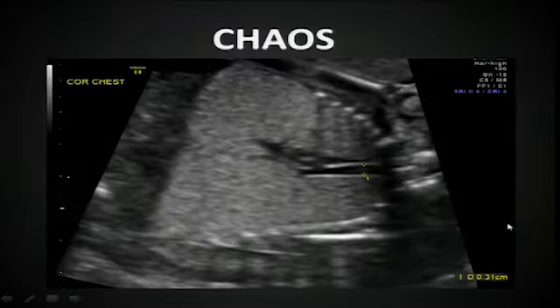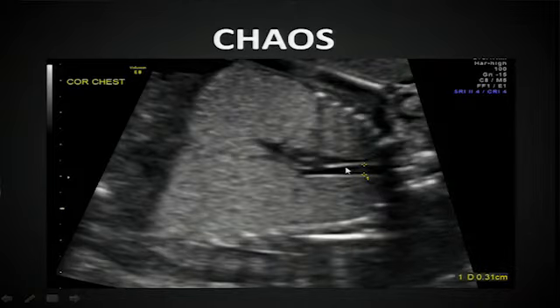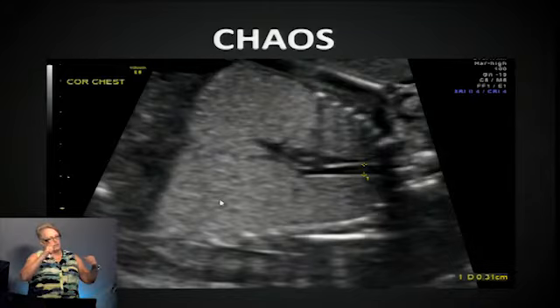This is a CHAOS. So what happens is, the lungs are producing fluid. If the fluid has no way to get out, it starts to enlarge. It's just like anything. If it's microcystic little areas, the lungs look echogenic because it has all these little spaces that are filled up with fluid. So it looks bright. And then you actually have inversion of the diaphragm.